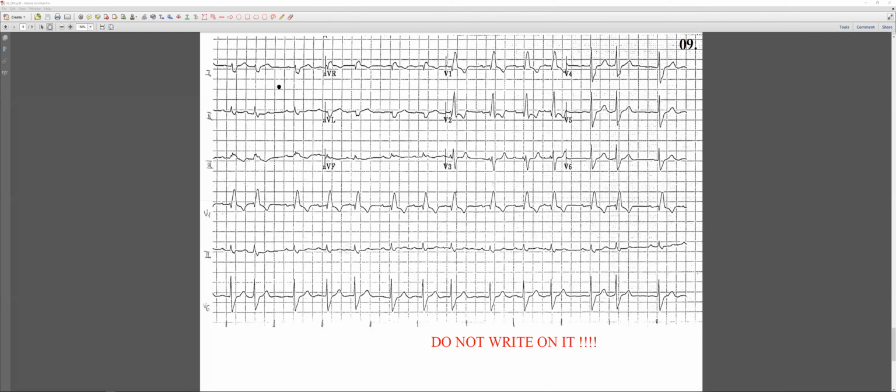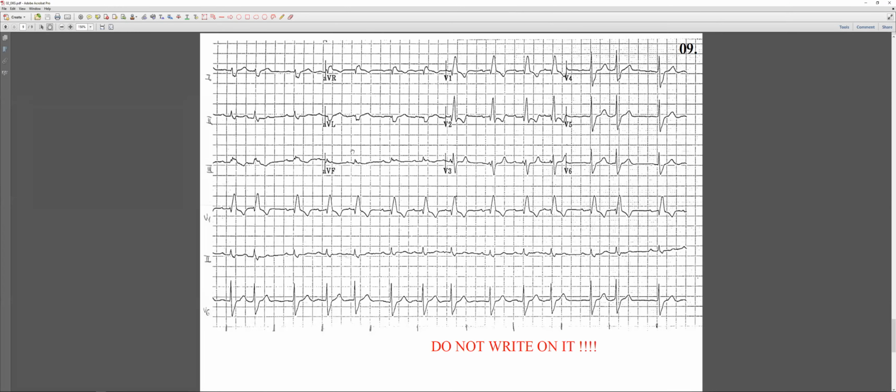How do I zoom in on this? Use the plus and the negative one. When you punch on the plus, you can magnify it. If you punch on the negative one, it goes smaller. It's a little bit too big. I'll just keep it there for now.